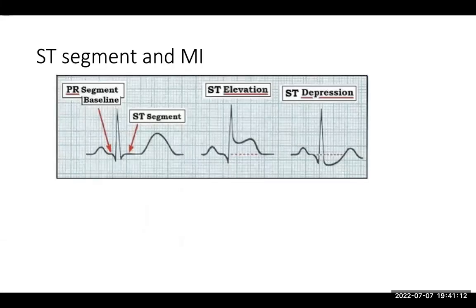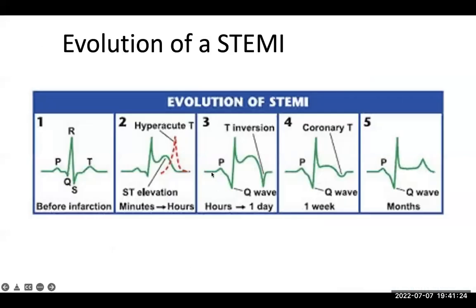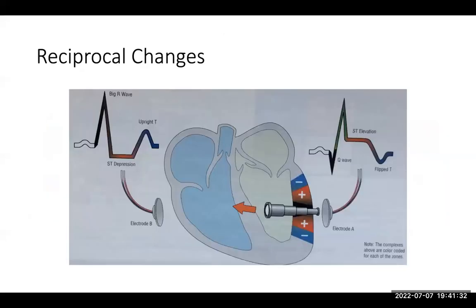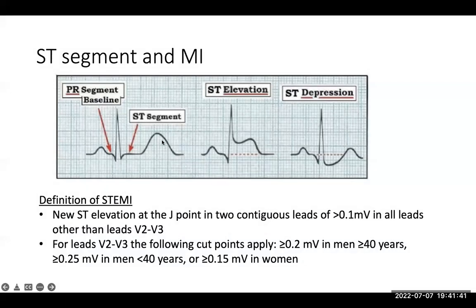Now we begin. What do you mean by the ST segment? And the area where we are interested in, which is defined as a new ST elevation. Sorry, let me just go back. Sorry, I'm mixing the slides. Yeah, so the area we are talking about is here.